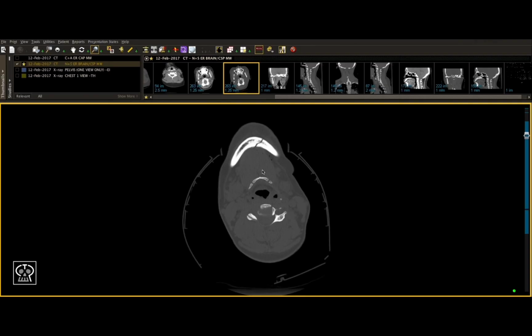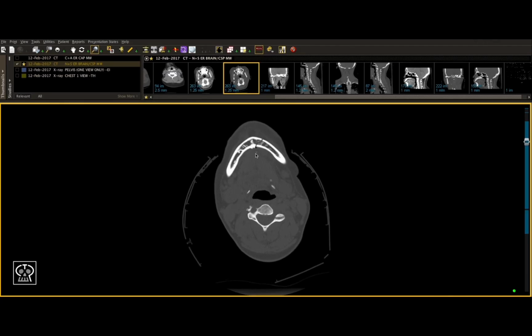As you get used to CT scans, you'll be able to identify these quickly and realize that this one, for example, is non-displaced. Although we can see a fracture line that extends from the outer cortex to the inner cortex, you can tell that it is a non-displaced fracture because the cortices are still relatively in line with each other. As we'll see in future examples, this isn't always the case.